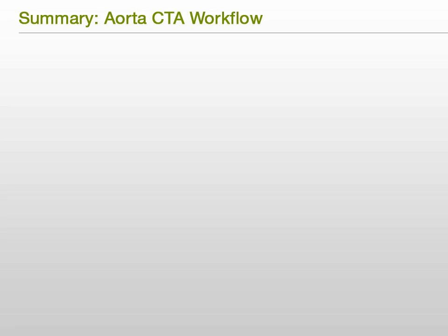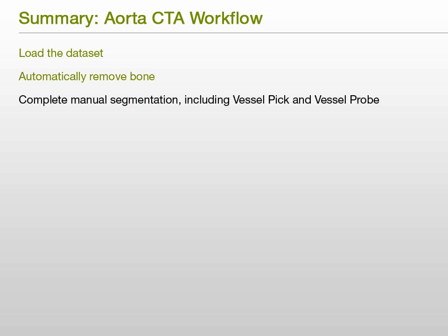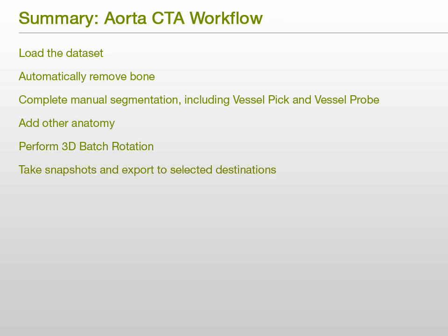In this presentation, we demonstrated how to load the dataset, automatically remove bone, complete manual segmentation including vessel pick and vessel probe, add other anatomy, perform 3D batch rotation, and take snapshots and export to selected destinations.